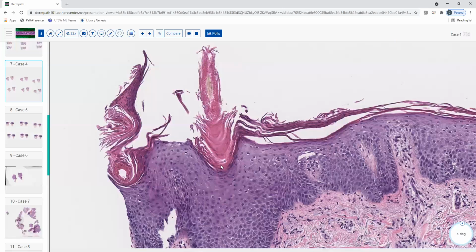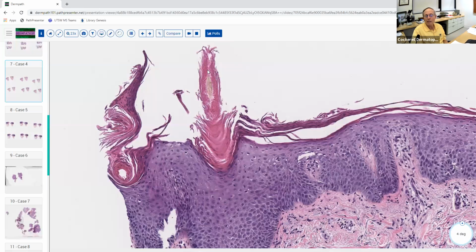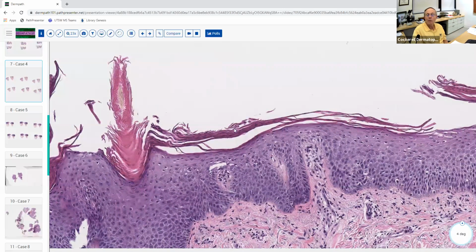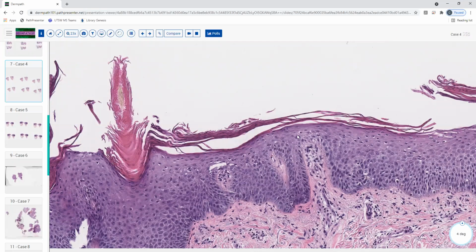Like a follicular plugging? Yeah, it's a follicular plug here. Good. And it's also got that alternating ortho and parakeratosis. We look over here, we see parakeratosis, kind of run our pointer over here, and then it's ortho and para again. And we go this way, it's ortho and para. So it's kind of alternating both vertically and horizontally.